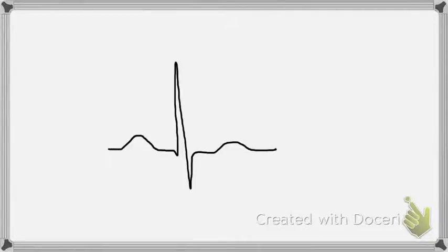Okay guys, I'm going to try to sum up a normal EKG or ECG rhythm for you. And here you'll see a very nice and normal rhythm.